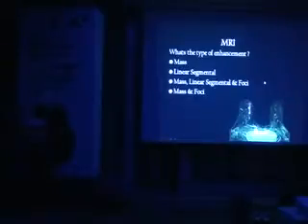A focus is a tiny enhancing lesion less than 5 millimeters. This one is more than 1 centimeter. One is maybe 12 or 13 millimeters and the other is maybe 2 centimeters or so. And each one has borders, has margin. So these are masses. But is that all? Are we dealing only with 2 masses? No, there are other foci of enhancement in the neighborhood and in between these 2 masses. Do you agree?